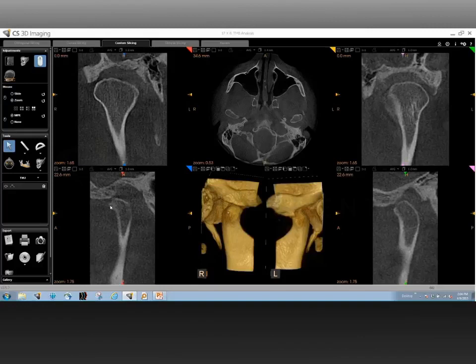Now, what do we typically look for in these things? We look at the smoothness of the surface, the smoothness of the structure of the condyle. We look at the smoothness of the articular fossa and any kind of other changes. You also see a little bit posteriorly some mastoid air cells, which is nothing but, as I'm pointing out right over here, these are the mastoid processes in which mastoid air cells exist.